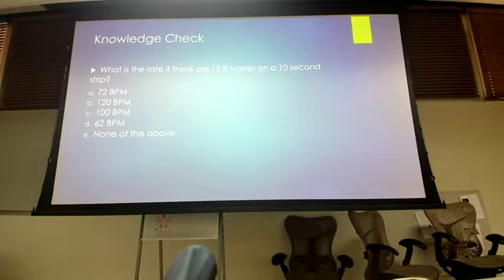Okay. When you have that 12-lead ECG, if I give you a 12-lead, that entire bottom strip is 10 seconds. So you don't even have to assume, we know that bottom is 10 seconds. Every time you see the 12-lead, if I'm asking the rate, you can look right at that bottom and you know it's 10 seconds.